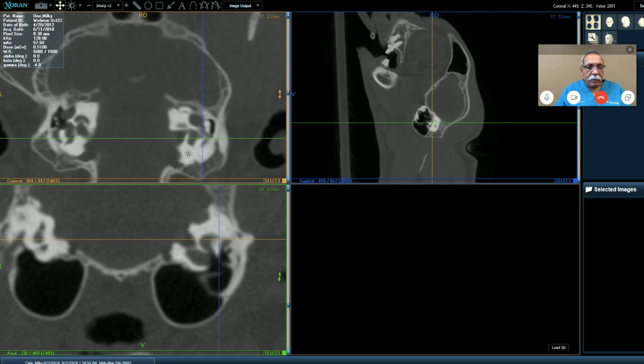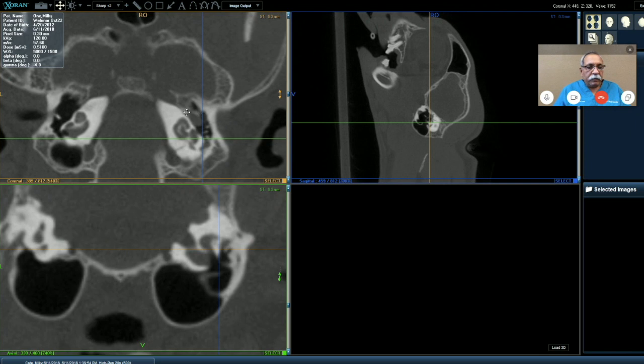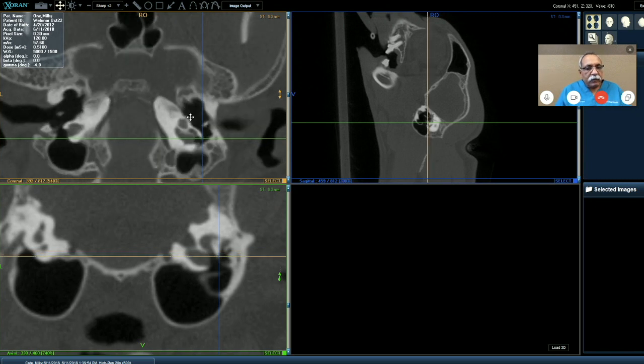And the eustachian tube is a little harder to see. It's very hard. In the dog, we will see that a little bit better. So if somebody wants to practice seeing feline eustachian tube, which is extremely difficult, if you look right there, yeah, that is the left one. And there, right there. If you follow it, you will see it opening up in the nasopharynx. And it tends to be a virtual space. So if I understand this, it's not truly a space, so it's not showing dark on the CT scan. Right, it will be soft tissue because it's collapsed. And eustachian tube has a peristaltic movement, so when it is closed, you generally don't get to see it very well.